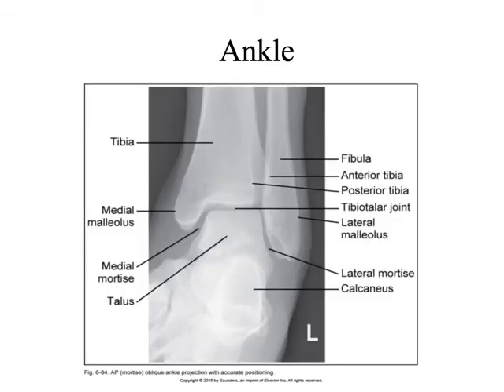One other thing we should mention on that image is we want to make sure, especially on these images, that our markers are appropriately placed on the side on which they mark, right? For instance, I would not want a left marker up here, correct? I want to make sure the left marker is on the appropriate side, okay? That it needs to be on the lateral aspect of the joint, in other words.